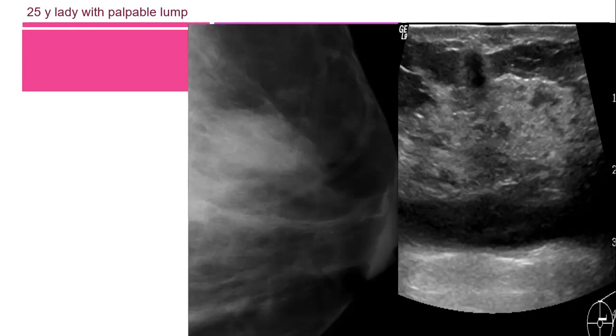When we talk about a capsule, we are talking about benign features. But when we talk about a rim or rind, an echogenic rim, this is a highly suspicious finding. Yes, non-parallel, heterogeneously deeply hypoechoic, spiculated, and it was invasive cancer. If you look here, it's projecting from the fat glandular interface into the anterior parenchyma. And she was lucky to be picked up as small as possible.